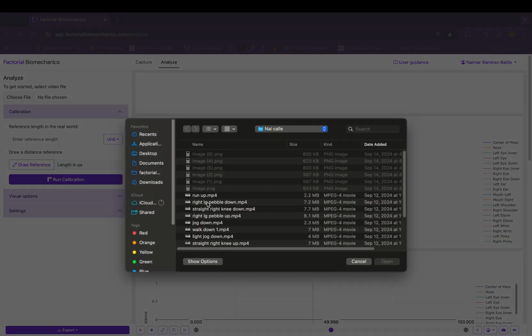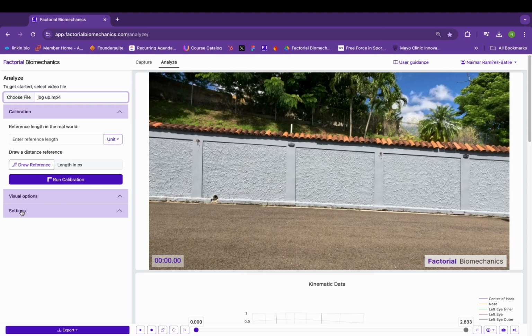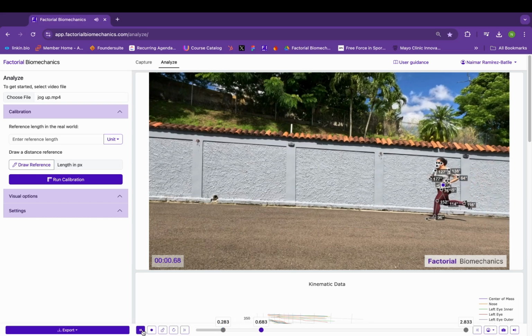Today, we're going to look closely at the graphs and what you can do in terms of calibrating, editing, and annotating. Let's start with a recommendation for videos where the subject starts outside of the frame and then comes into it. Go to the point in which the body is fully recognized and then step back manually with your keyboard arrow or step button. This will ensure the joints are plotted correctly since the beginning. You can also trim to the appropriate places.